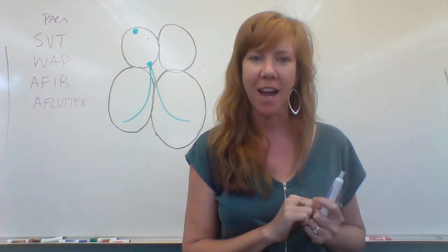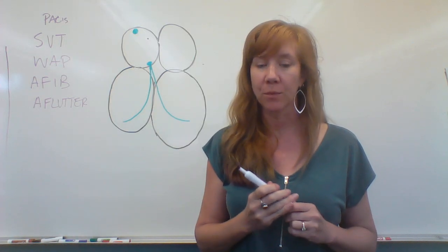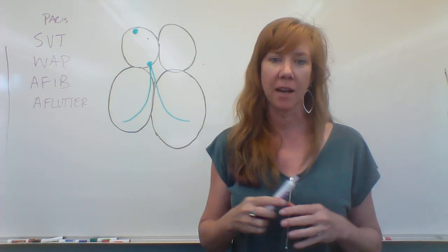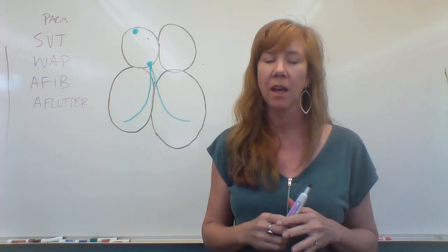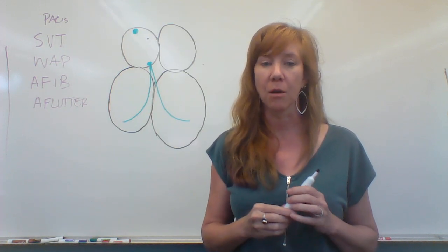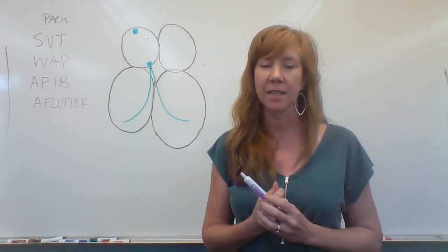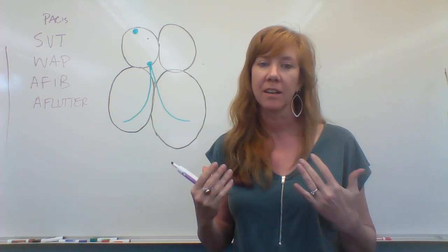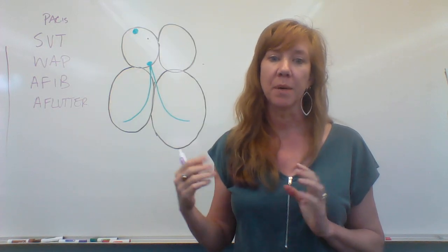Okay, I'm back. So sinus rhythm with PACs is a very common rhythm, and it's very benign. PACs don't usually cause any problem. We don't really have to do any treatment. A lot of people with lung problems like COPD, this is their normal underlying rhythm, sinus rhythm, sinus tach, because they tend to be a little hypoxic all the time with a lot of PACs.